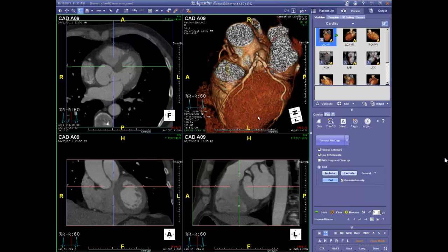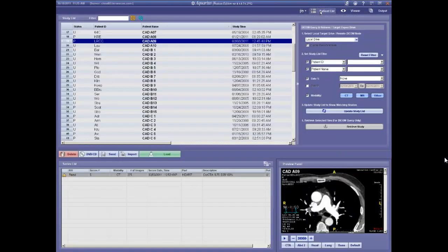A lot of these corrections, by the way, are really meant to be done, or can certainly be done, by support personnel, the CT technologist or the image extenders that may exist in the lab. And so part of the nice thing about this is that people can go ahead and prep these studies for your review and really save you quite a bit of time if you don't want to spend the time to do the editing yourself. Let's go ahead and close this out, and I'll take that question up. I think I'll get a chance to on the next case.